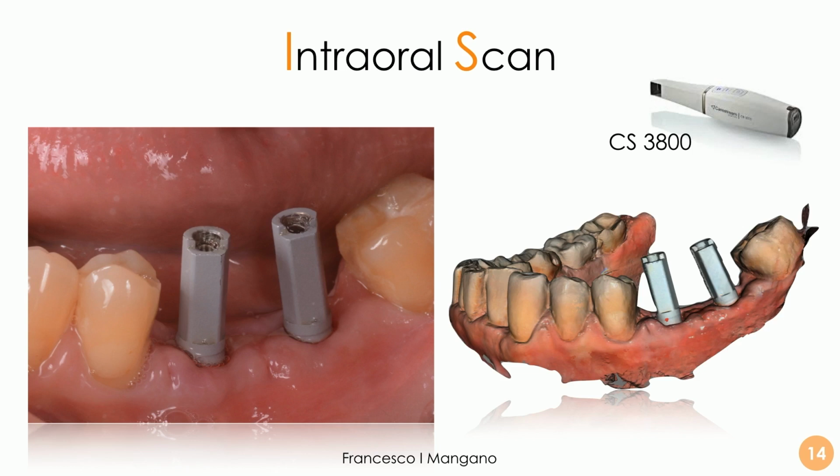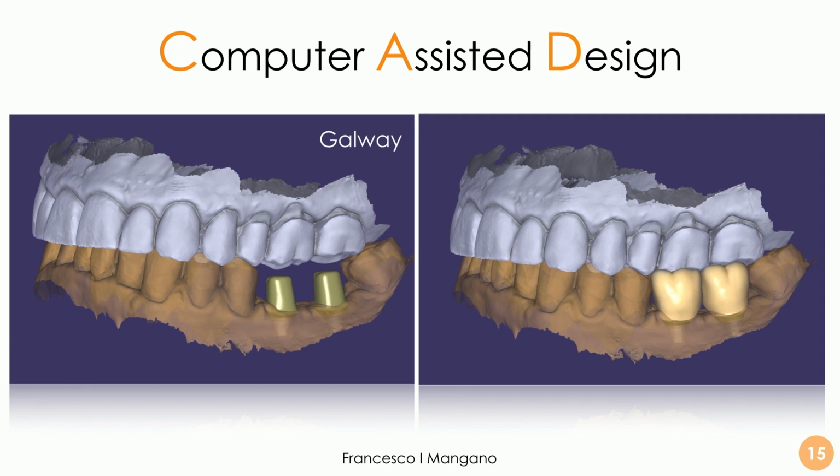And after this, we can easily send all this file in polygon file format, PLY, or in STL, standard tessellation language format. We can send this file to the dental technician. The dental technician can use Exocad to model the individual hybrid abutment and the definitive crown. And it's quite easy. The definitive crowns are monolithic restorations. In this case, in zirconia, it's a bridge in this case.